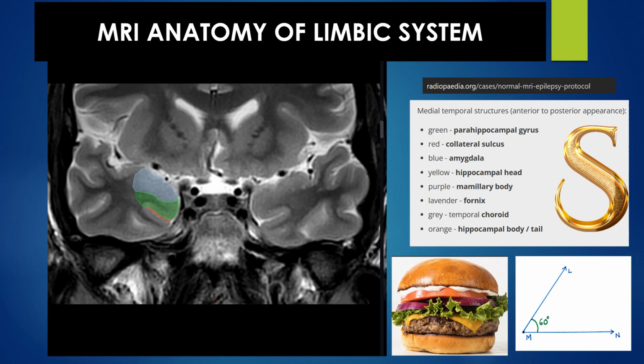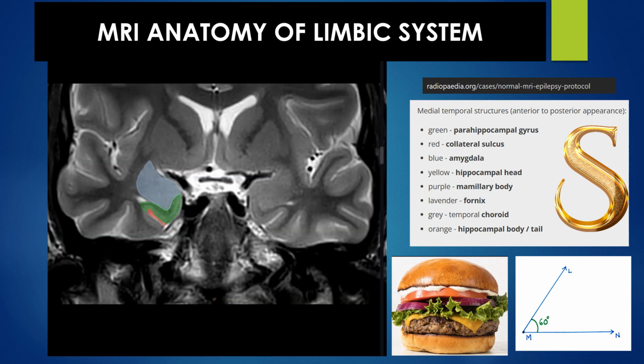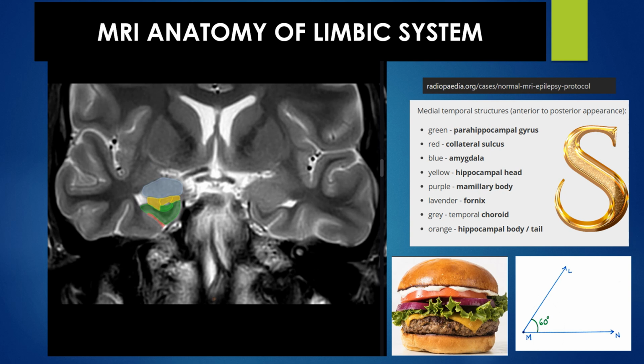So let's move a little bit posterior and see what's happening now. So again, amygdala. We are able to see the amygdala better. See, this is the entire amygdala. This is the parahippocampal gyrus. Scroll it a little bit posterior. Yeah, we'll stop it here actually.